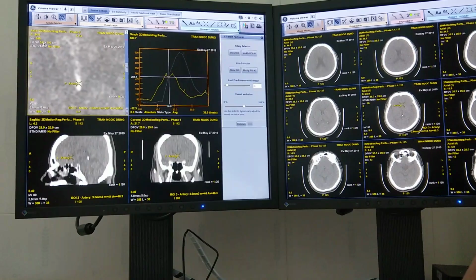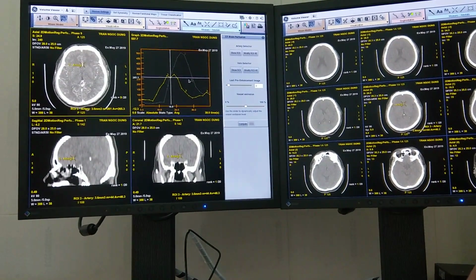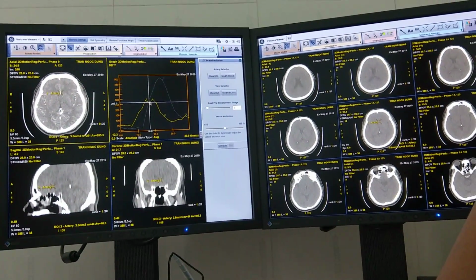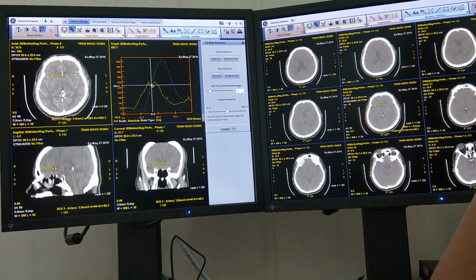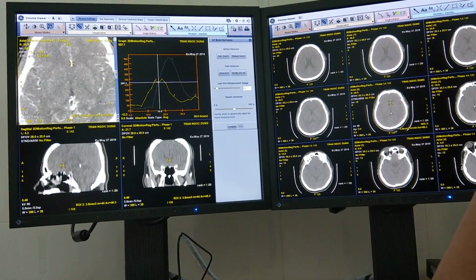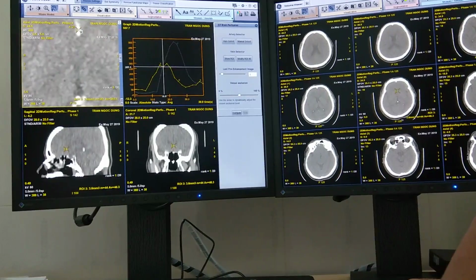Thì đôi khi nó tự động nhận diện không chính xác động mạch đó, cho mình muốn thay đổi đó, mình chọn cái động mạch khác. Right? Look at like this. It's not good, right? So I don't want this. I don't want this graph. So I can modify. I can actually adjust. Probably the location is not accurate.